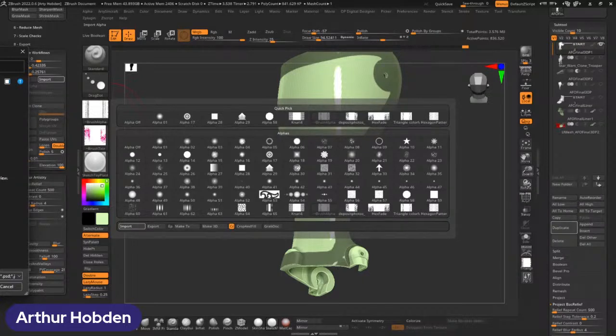Yeah, come on. Oh, there's so many files when you do this kind of stuff. It's just everywhere. File used.